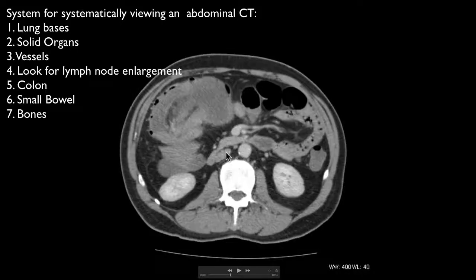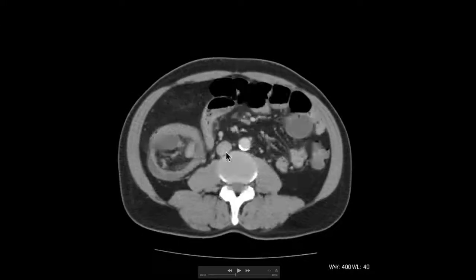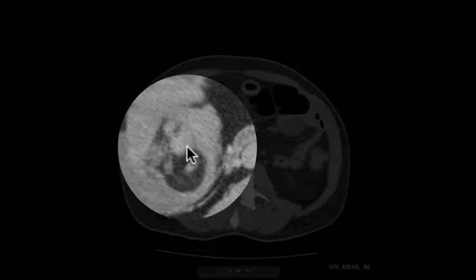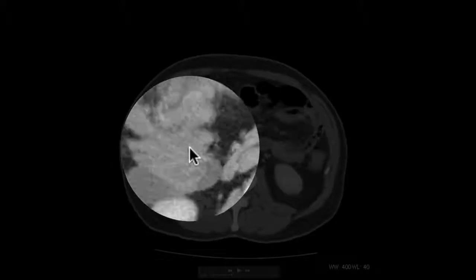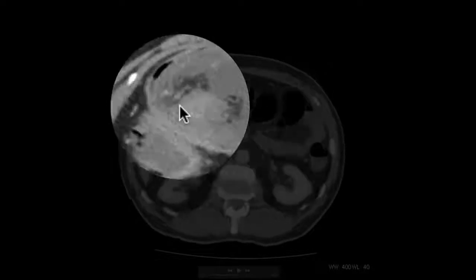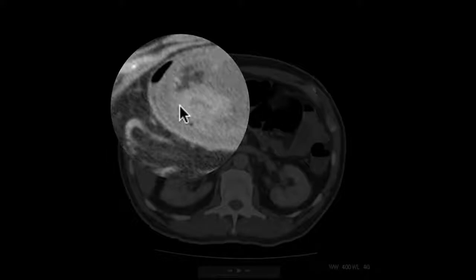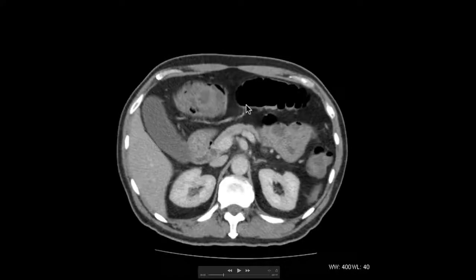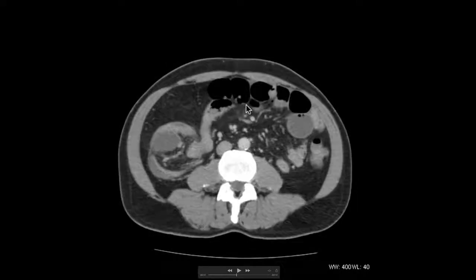I'm sure your eagle eyes have already picked out the abnormality here. This is a great example of a patient with some bowel pathology. This is the ileum coming down towards the ileocecal valve. As it passes up, you can see this very abnormal looking bit of bowel, and you can see this cuff of fat around the small bowel as it's going into the colon. This is a patient with intussusception. So you've got the bowel being pulled through within the large bowel, with fluid and fat around the outside. This patient had a malignant lesion near their ileocecal valve and presented with intussusception.